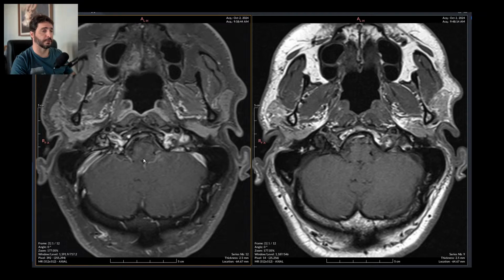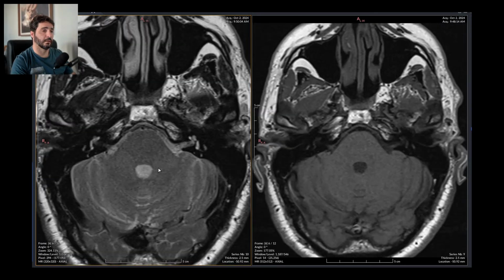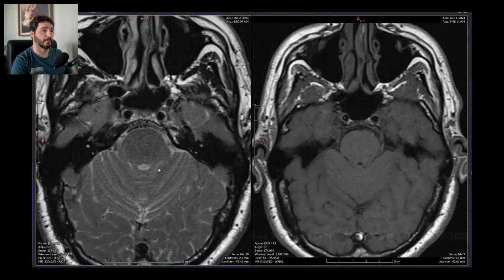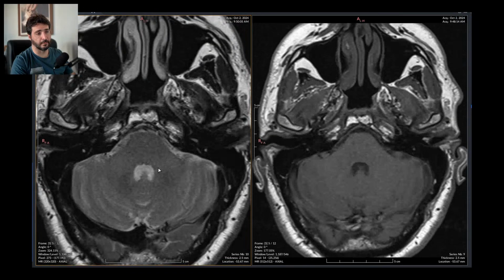No justification, no motive for hearing loss, symmetrical nor asymmetrical in this case.